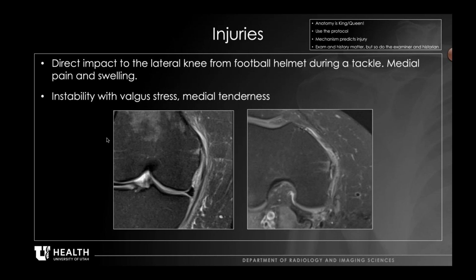What's that line called again that we're supposed to? It's called Blumensaat's line. Blumensaat's? Yep. Okay.